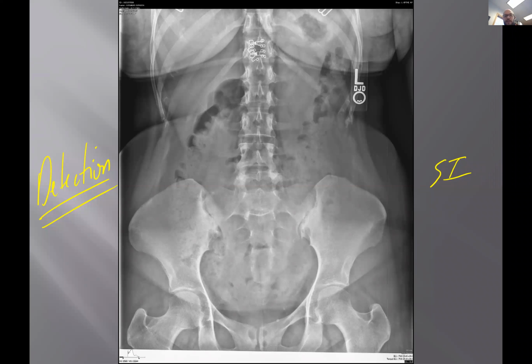Any thoughts of a condition that could give triangular sclerosis of the SI joints following the context of stress to the pelvis? Of course, probably created some of these subchondral cysts as well in the symphysis pubis. Anybody remember that condition? Diagnosis, let's slam dunk it. Anybody got one for me? Chronic sacroiliitis. Okay, so differential is sacroiliitis. Osteitis condensans ilii. Osteitis condensans. Okay, good. That's a great differential.